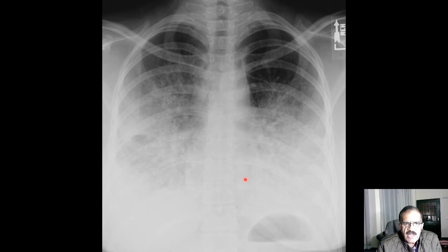This is again similar, but this X-ray I'm not exactly sure. It could very well be bilateral extensive pneumonias, but since we do not see costophrenic angles, cardiophrenic angles, diaphragm, there is perhaps some pleural effusion also. It is not simple pleural effusion because this part is not typical of pleural effusion. Simple pleural effusion would cause very homogeneous opacities with curvilinear borders. So this part is, I think, consolidation.